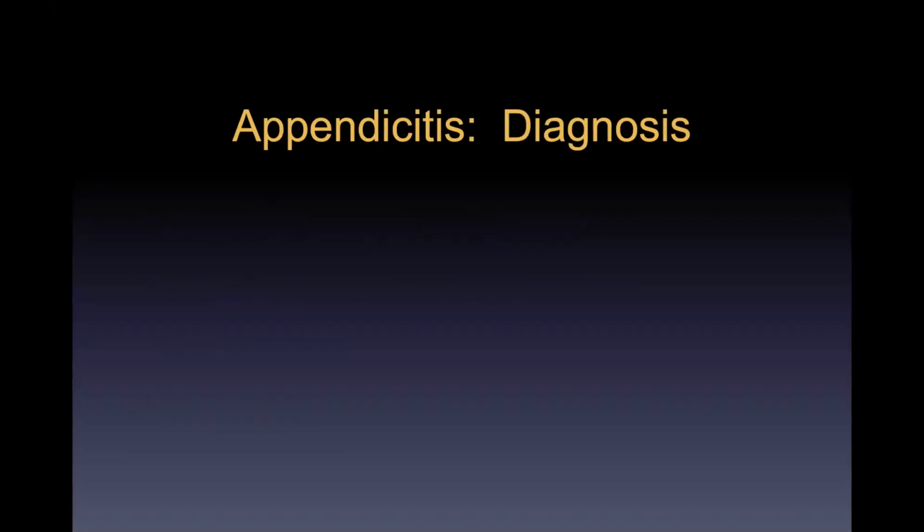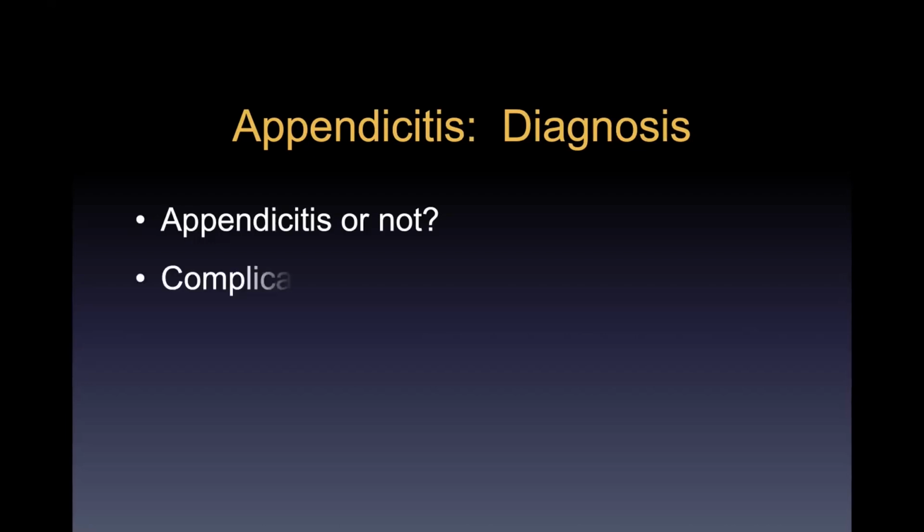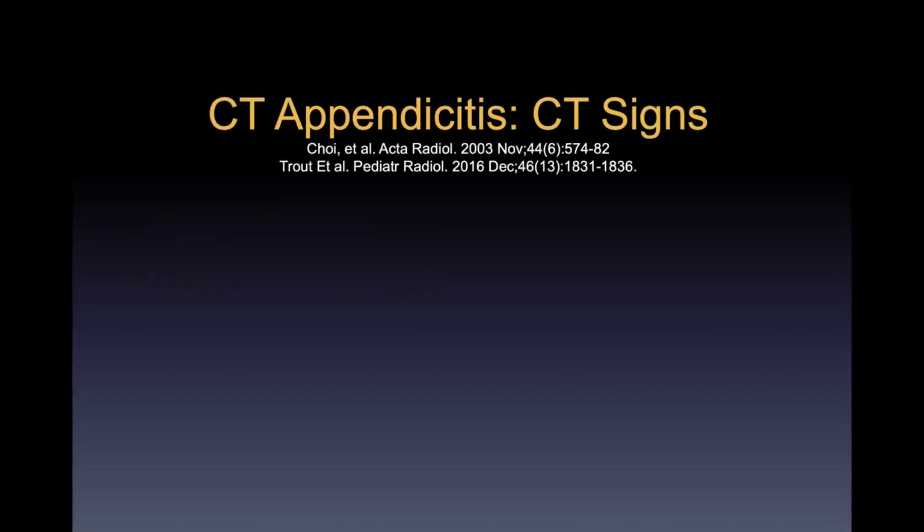Okay, so diagnosis. This is pretty straightforward. When we want to make a diagnosis of appendicitis, we're just trying to figure out, number one, if appendicitis is present or not. And number two, is it complicated or not? Because obviously that can affect patient management. So let's start with these two points. Do we have appendicitis? What is the best sign for appendicitis at CT?